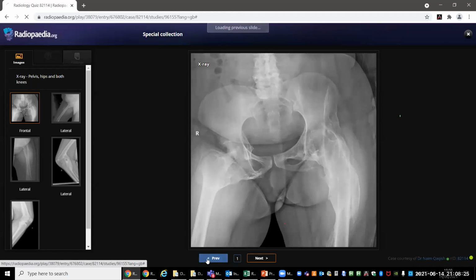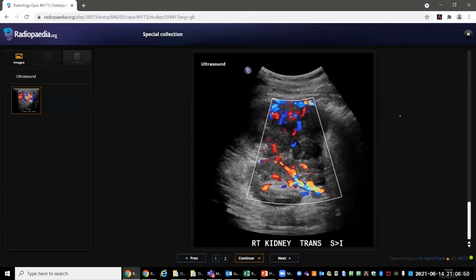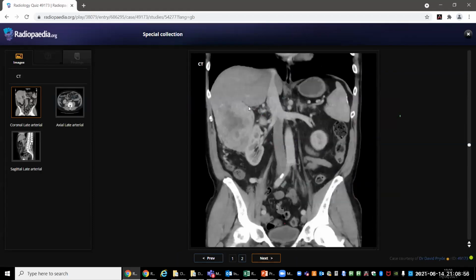You're welcome. And this one. What I wanted you to do was examine the abdomen of this patient. When you see a unilateral varicocele, you want to look above to see if there is a mass or an obstruction from above. This actually had a mass in the retroperitoneum, and there was a CT. The mass is very vascular, with an abnormal vein draining into the gonadal vein and rendering it incompetent. That was what was causing this patient's varicocele.